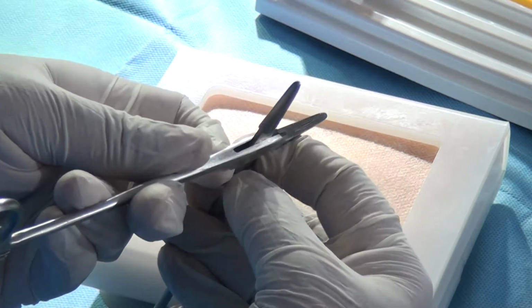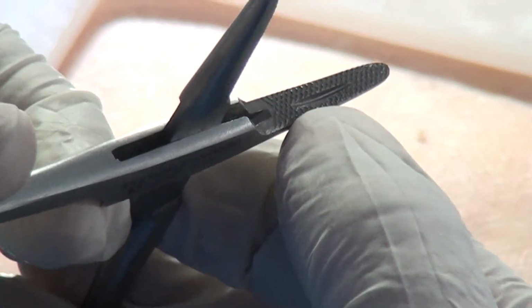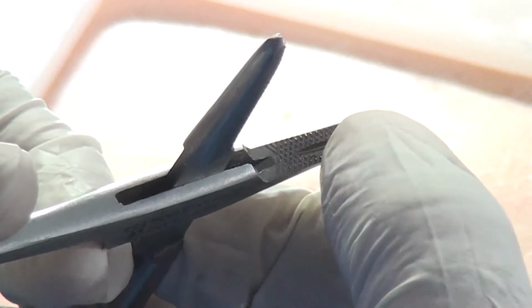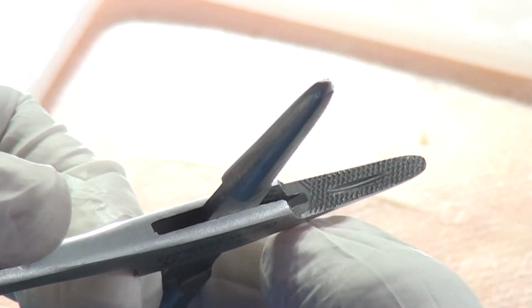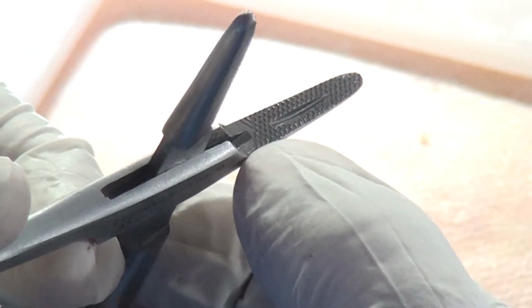Can you zoom here, please? Thank you. Lovely, excellent. Now this is what you see, and there is a groove which is for the needle to sit. Now watch the serrations, they are not transverse, they are crisscross. I will tell you a reason why. Why more than one ratchet here is what I will explain to you just now.